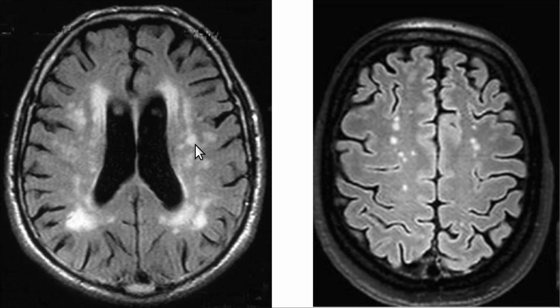All right, these are all silent strokes, and I'm going to give a separate lecture where I talk about what causes these. I think the main cause is atherosclerosis and overtreated hypertension. Okay, things that cause cerebral hypoperfusion, lack of blood flow to the brain. And again, this is just one patient. How many strokes is this? It depends how you count it.